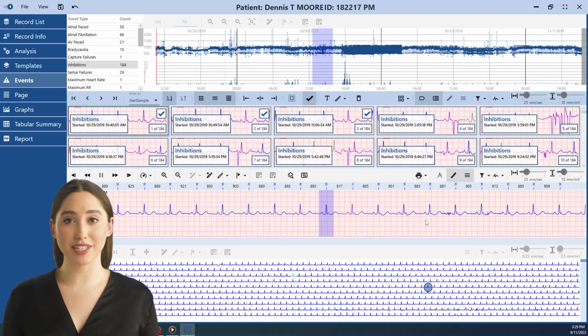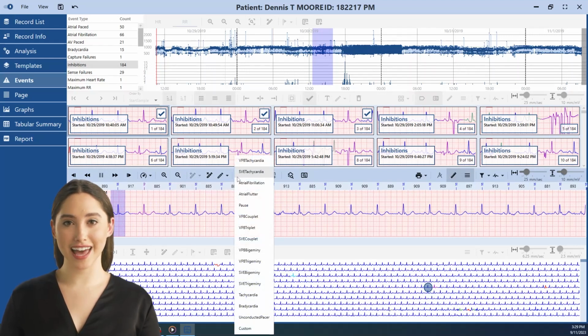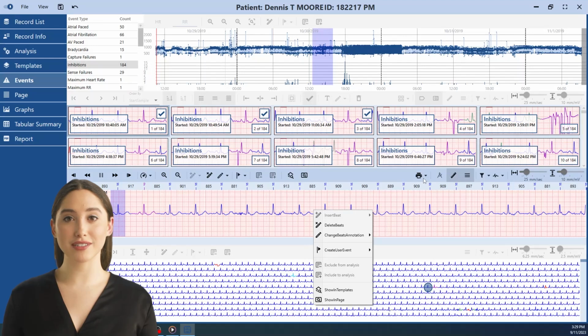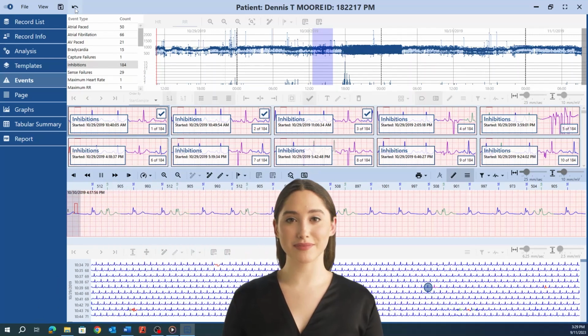Here, you can preview and scan ECG traces, create user-defined events, manage beats, exclude noisy segments, and print ECG examples. Settings are auto-saved per arrhythmia type for future sessions. Use the Undo button to reverse recent changes.